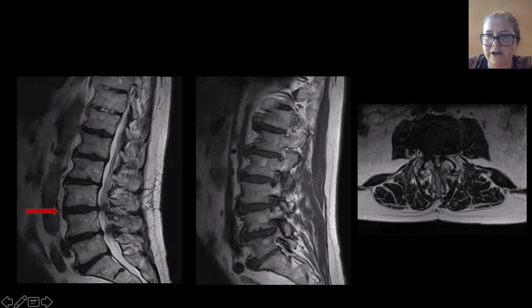So here you've got a disc bulge. You've got facet OA. Could we call it severe? Probably. We've got pretty big osteophytes, subchondral cyst, irregularity of the articular surface. You've got thick hypertrophy. Again, you can call it thickened ligamentum flavum, and you can call it hypertrophy, but technically the cells don't actually increase in number or size. And this is compressing the thecal sac. Don't see really any CSF. The nerve roots are aggregated. I think most of us would agree it's severe.